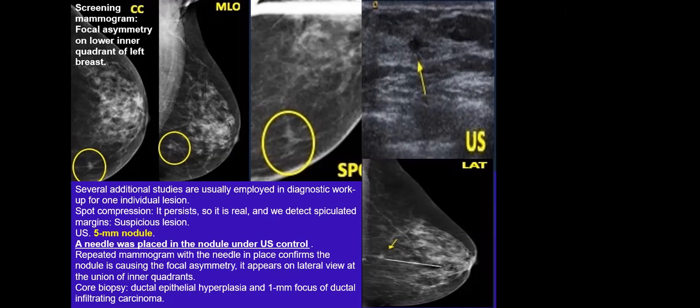To confirm the biopsy is taken from the corresponding asymmetry, and here the asymmetry on the mediolateral to lateral view is just a little bit superior. Look, it is superior here. It is in the lower quadrant, and here going toward the central quadrant, a little bit higher because it is on the medial aspect.